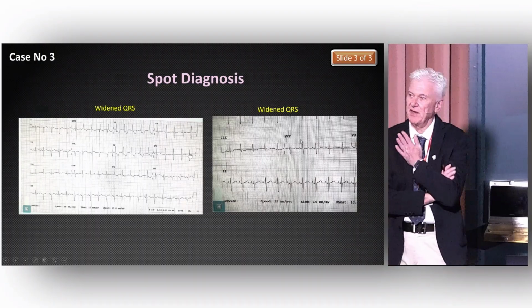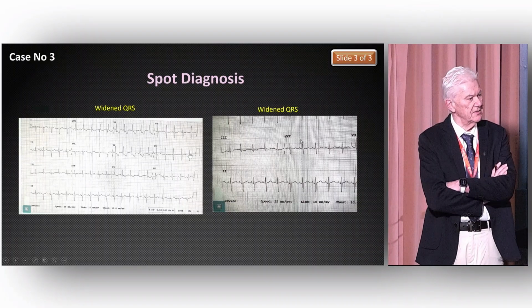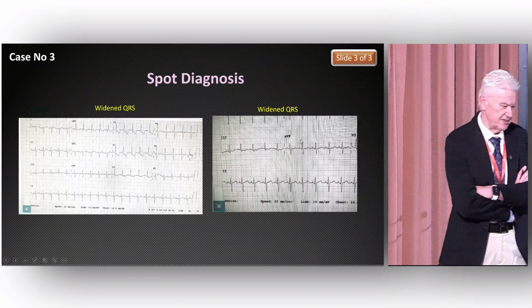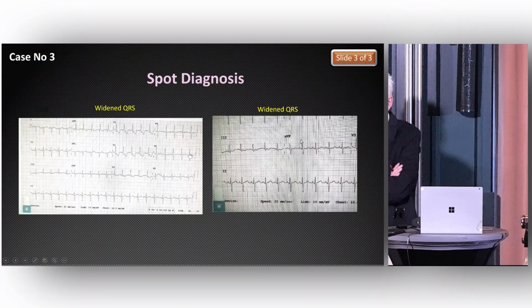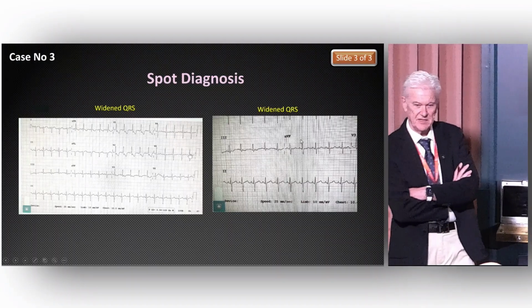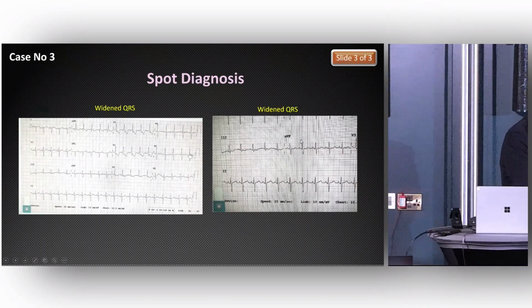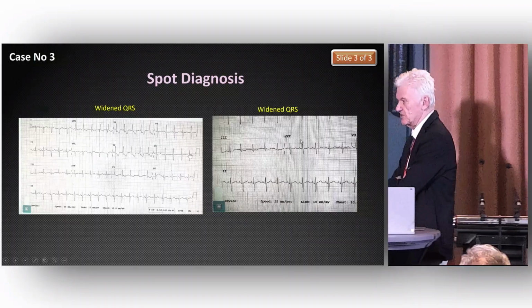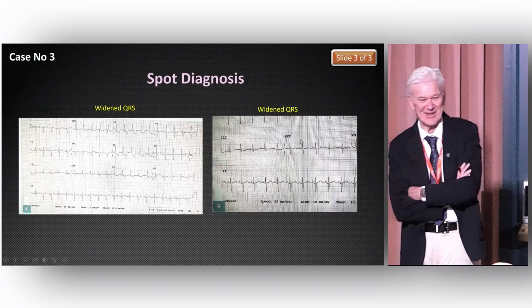But looking at it, I said, oh my God, that's a horrible diagnosis to make in terms of a ventricular aneurysm, carrying an absolutely terrible prognosis. But after birth, this baby has done quite well, in a sense, because they dropped their pulmonary pressures. The actual work and the load on the right ventricle is much less. And this baby, while admitted to NICU, was only there for 2 days, and then literally 5 days later is discharged home. And hopefully next time I come back, I'll update you on how she's going.